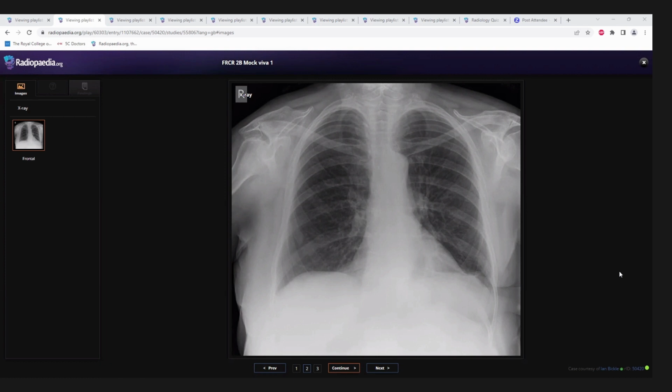Doctor, would you want to take another look at the X-ray, please, and give me a little more description? Okay, there is a rounded, well-defined retrocardiac opacity. You can ignore that, I think it may be projectional. It's not there. Yes, I'd like to take a general look and also see the review areas.